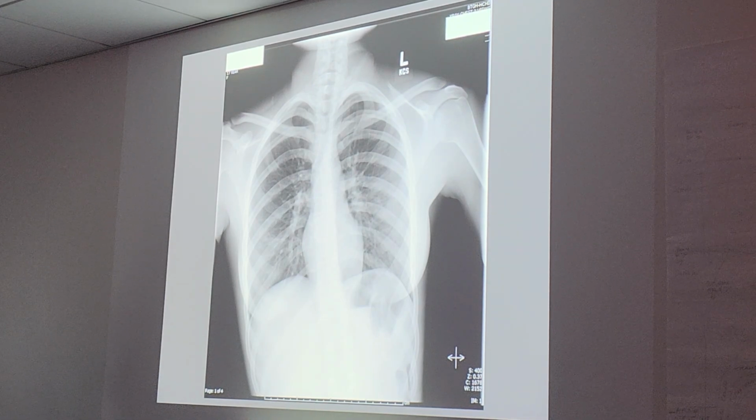The markers are not really in the anatomy. You can see too almost the base of the skull. It's too much. Or it looks like it's their chin. So collimation's very open.